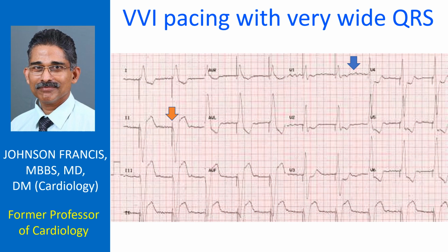The enhanced width of the QRS indicates a higher amount of myocardial damage, which has led to the ventricular dysfunction and a more disorganized intraventricular conduction. The wide QRS with left bundle branch block pattern in right ventricular pacing could worsen the left ventricular function by intraventricular dyssynchrony between the contractions of the interventricular septum and left ventricular lateral wall. This is one of the downsides of right ventricular apical pacing. The apical location of the pacing site is evident from the negative QRS complex in the inferior leads.